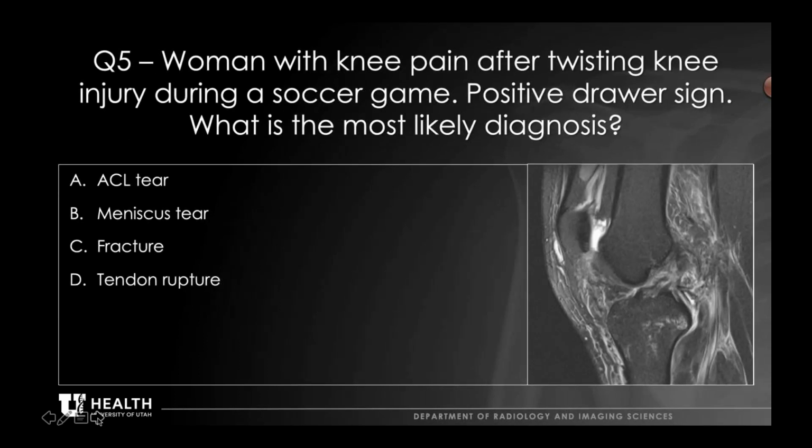Last question. This is a woman with knee pain after a twisting injury during a soccer game. She had a positive drawer sign. What is the most likely diagnosis?